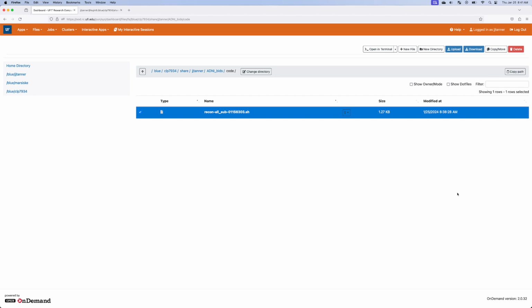It's free. It's pretty quick to download and install, and you could use that. But just for our sake, I'm just going to do this all in the browser.